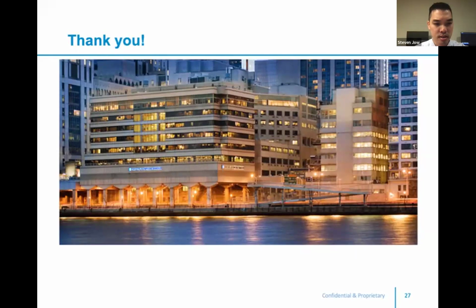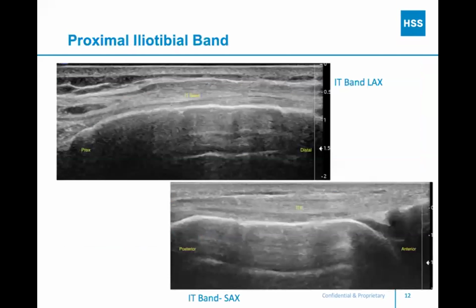Sure, yes. One thing that definitely needs to be noted and can really confuse people on the lateral IT band: on that bottom image, you have the patellofemoral recess on the right side of the screen, and you can actually see some of the cartilage coming off. And so that lateral joint recess actually extends underneath the anterior edge of the iliotibial band at the level of the lateral femoral epicondyle. So if you have fluid deep to the IT band, that does not always equal IT band bursitis, as you may call it.